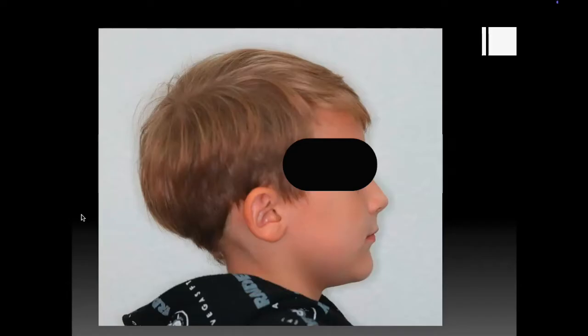So let's take a look at this profile for a minute. When we have profiles, we're looking at a number of different options on the way to describe that. So you mentioned one of them is straight. So what are the other ways we can describe a profile, and what is it telling us? Convex, concave. Convex and concave. All right. So what do we see in a convex profile? What are we identifying on the image that's helping us to know it's convex, and what does that mean clinically?